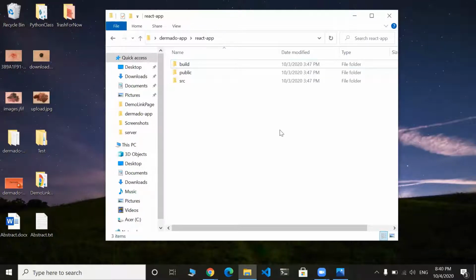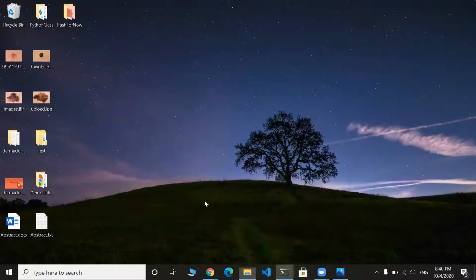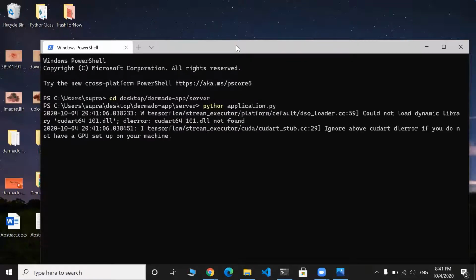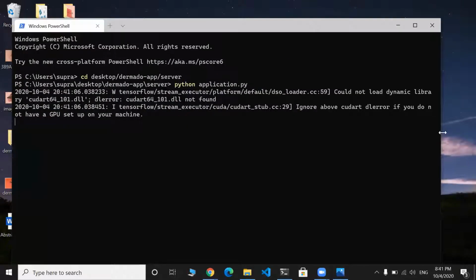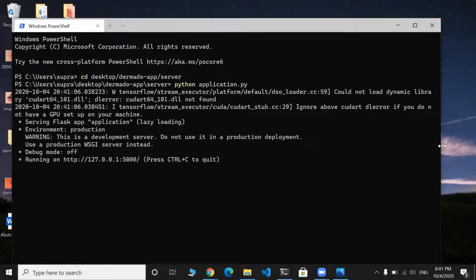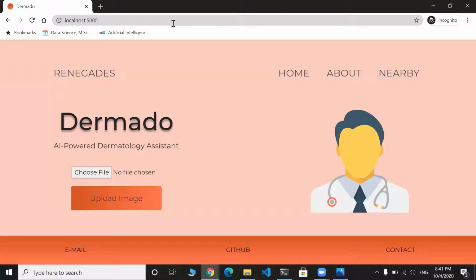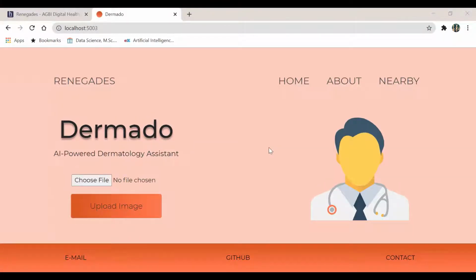So what I'm going to do now is I'm going to go ahead and start the server. All right, so our server is up and running now. Let's check it out. And here we have our landing page. So taking a quick tour, we have a bunch of stuff here.